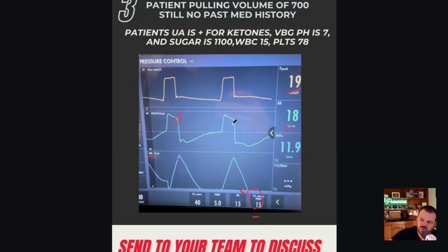That being said, the way that this looks, the curve, if they were really sucking down, should be more kicked out. We've seen that before. With this, it's more straight. So I don't know how much the patient's really sucking in very hard on the circuit to get flow. Based on this flow curve not being super kicked out, I don't know if they're working to breathe incredibly hard, let's say. So the thing that would worry me about this is, it's giving the feel that it has a high compliance situation.